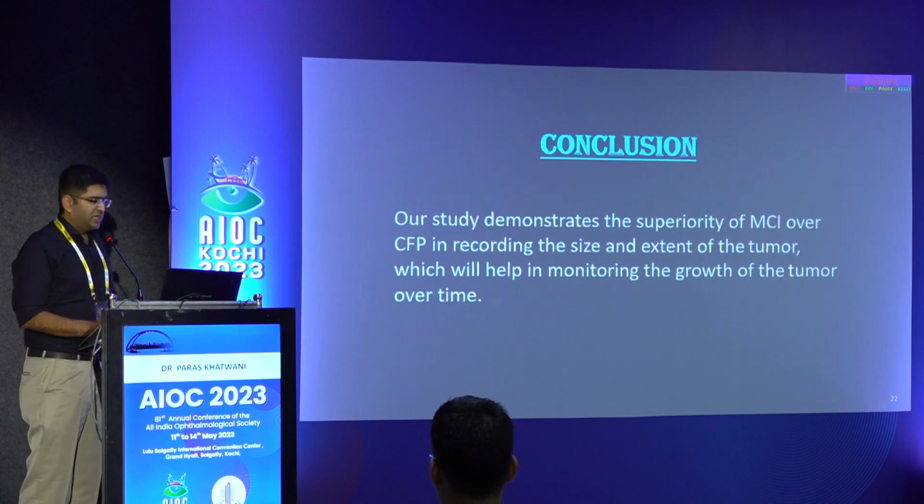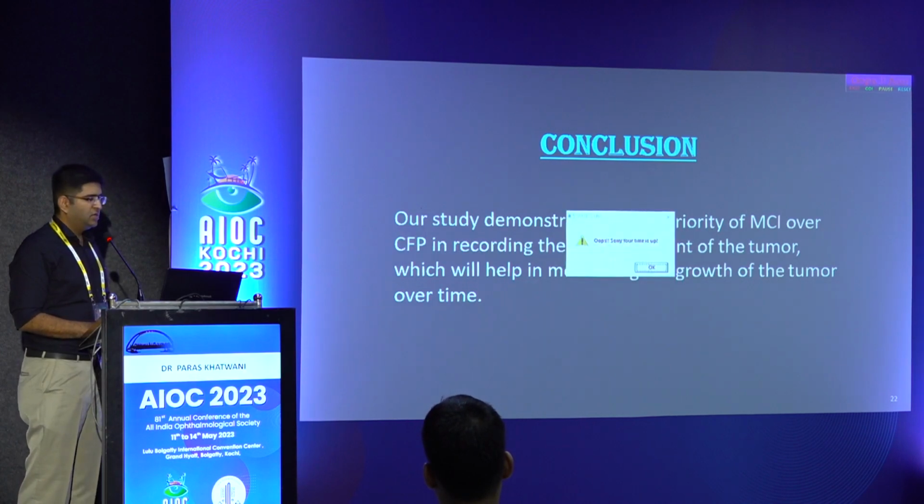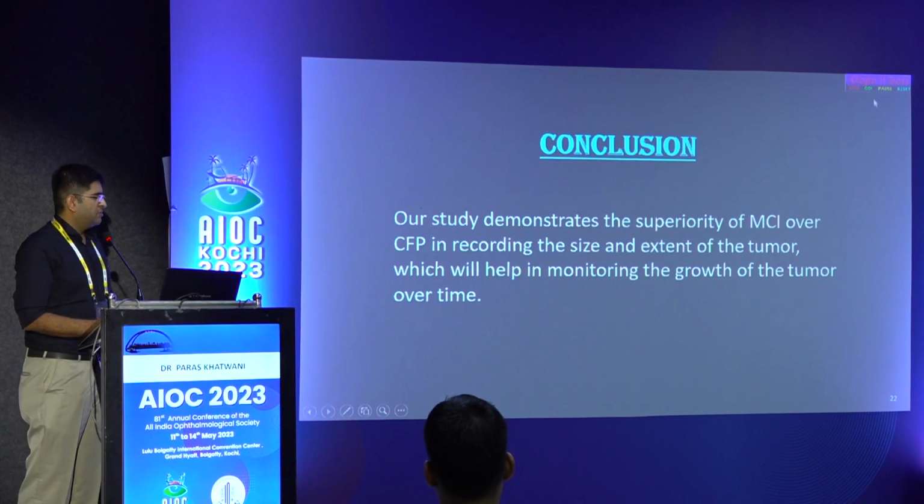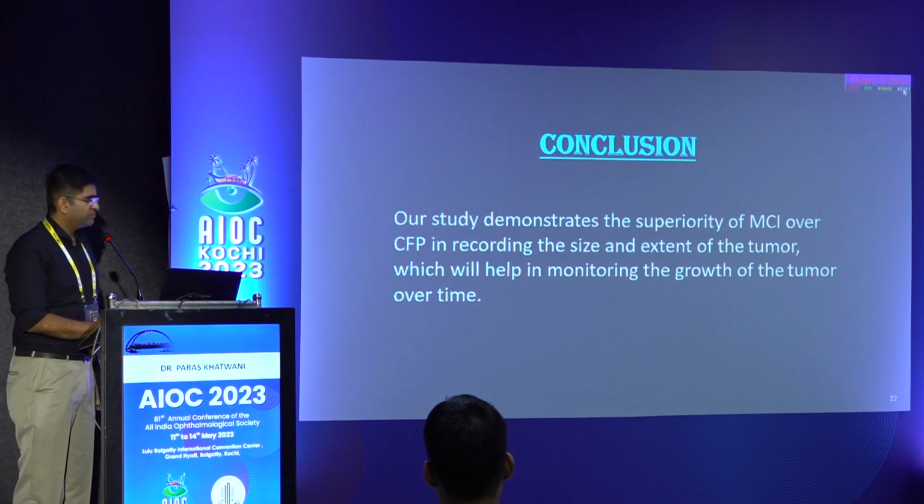And hence MCI is definitely better than conventional fundus photograph, and whenever possible should be brought into clinical practice as a routine means to follow up the patients of optic disc melanocytoma. Thank you.